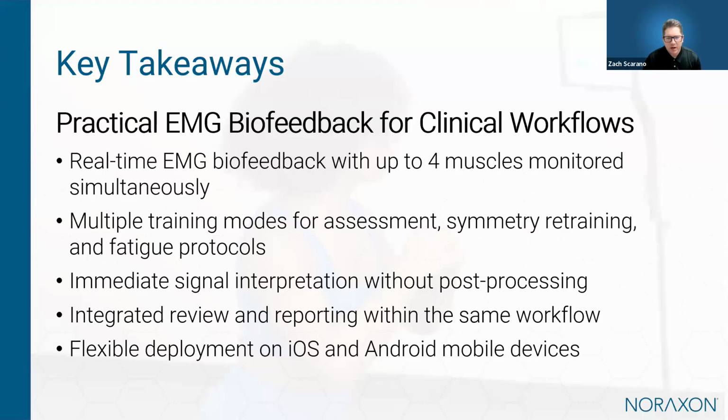And so whether you're working on muscle activation deficits, neuromuscular control, fatigue and endurance, movement coordination, or symmetry restoration, the biofeedback app integrates directly into those interventions without adding workflow complexity.